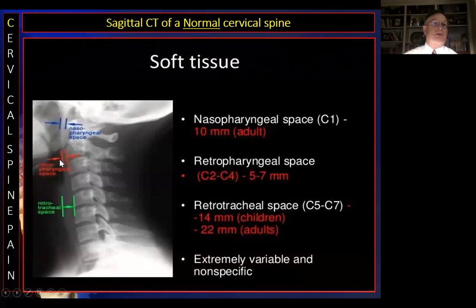Now, it'll push this soft tissue out. And remember, soft tissue is gray because it's water density on X-ray. And the supraglottic airway is black because it's mostly air. That's thickened. You've got to explain why.